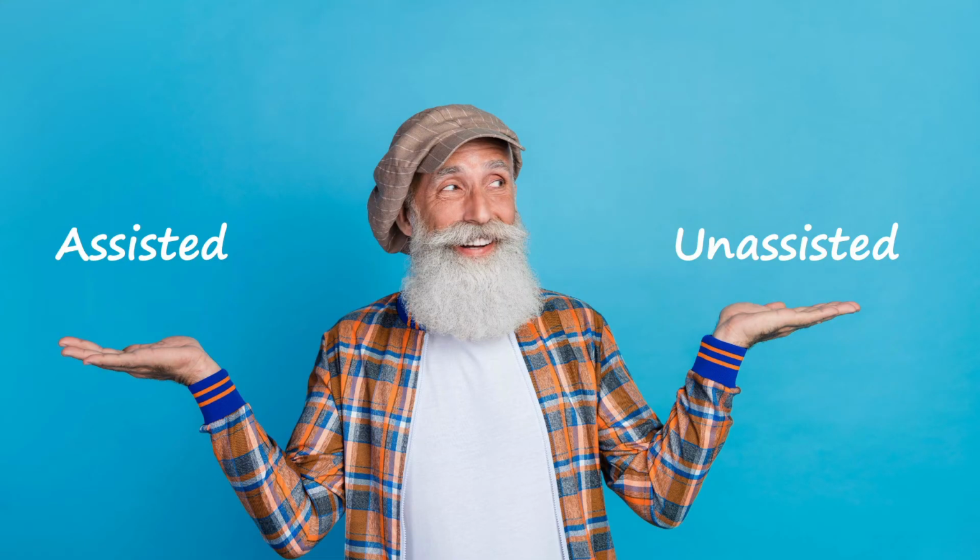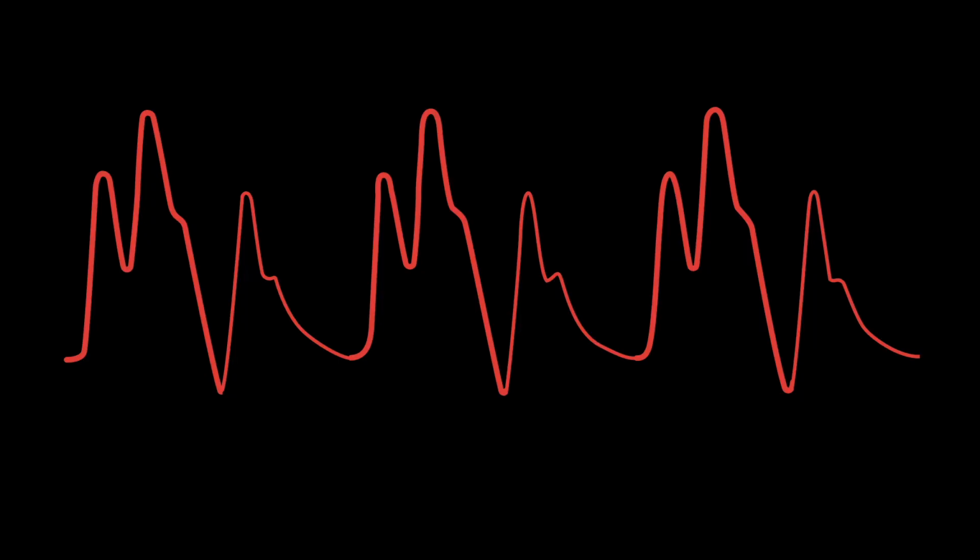Now, we have to think about the terms assisted and unassisted. Assisted refers to a pressure that's been helped by the balloon pump, and unassisted represents the patient's own hemodynamics without any help. So, pause the video for a moment and identify which spot on this tracing would represent the assisted end diastolic pressure. That's right.